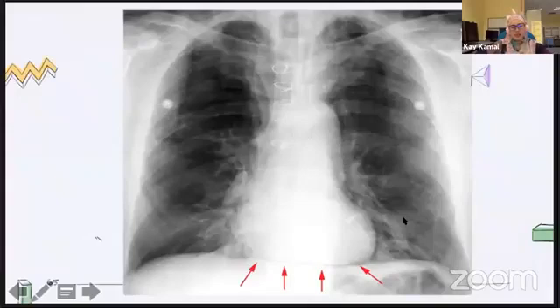For example, some people want us to look at TAA, thoracic aneurysm. But it's in an old patient with long standing hypertension, and then under-inspired too. Normally I say take a good inspiratory X-ray first, and we have a look, because many times I've been fooled. Eventually you see it's just unfolding of the aorta because of long standing hypertension in an elderly patient who did not take a proper breath. It's a loss for the patient, having to get contrast and come in for everything.